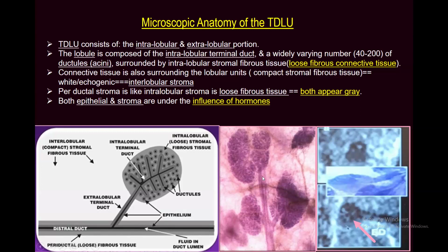And again, here you can see it in histopath image. This is a lobule, extralobular duct, and a main duct. While this image is from Stephanos' lecture, you see, he presented a normal terminal duct lobular unit in longitudinal and perpendicular transverse image.